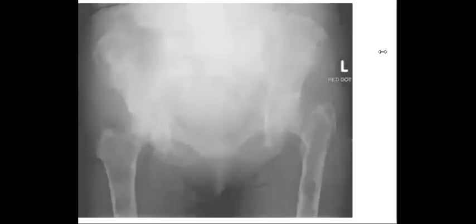So try to focus on this one. And try to describe, so frontal radiograph, pelvis of adult female, sort of adult, whatever. Try to find the big title.